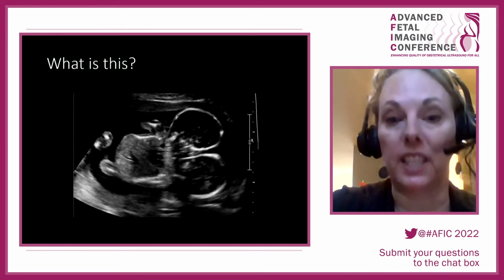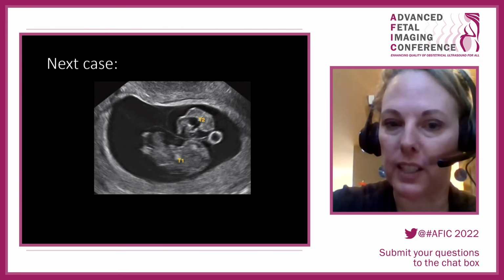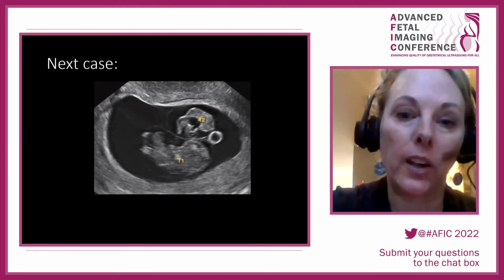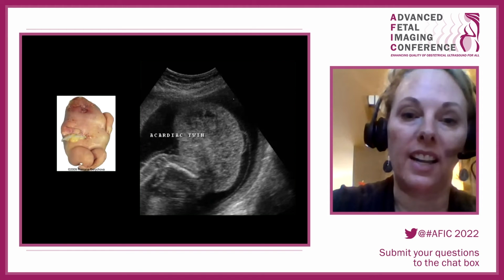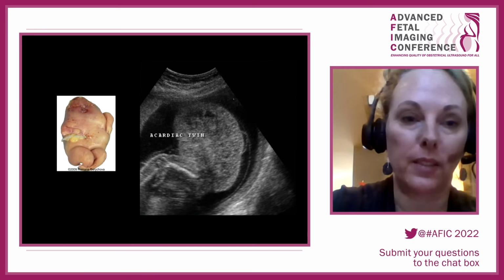This picture here, that actually is conjoined twins, very rare. And this is another complication of monochorionic twins, and that's the TRAP sequence or the acardiac twin. So you basically have one baby that's normal, a second baby that does not have a heart, and therefore would have been a demise in a singleton pregnancy. But essentially, one baby's heart acts as the heart for two, and as a result, you have an acardiac twin that is kept essentially alive by its pump twin, and that results in a high chance of hydrops and fetal loss for the baby. That heart has to work twice as hard.